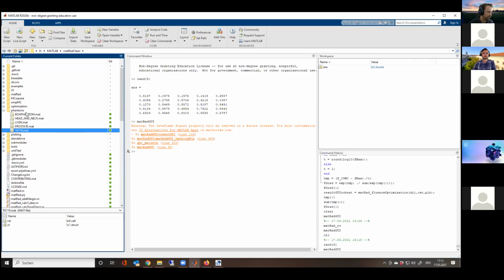The box phantom is really just a water box without anything. It's just an artificial box of water. It's not existing; this is not really an image of a water phantom, this is basically an artificial box. We will use both of those as well, because sometimes it's very easy to learn something from these geometries, because they are very simple. You see the features that you want to see, but we will also work with these patient files that give you a more realistic idea of what is happening.